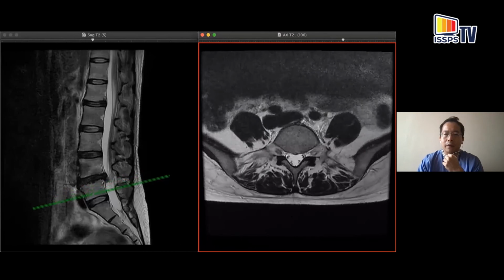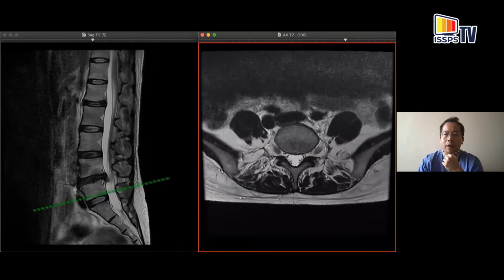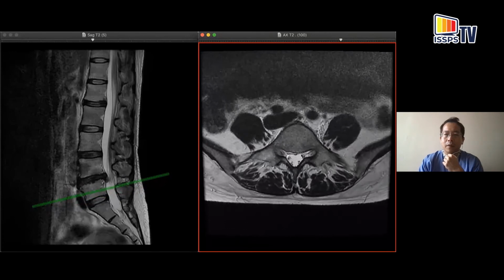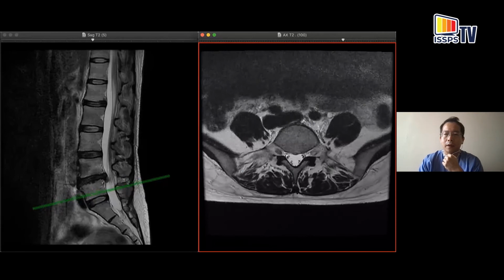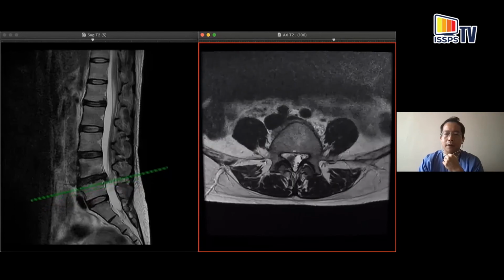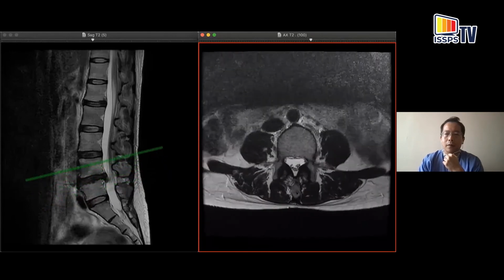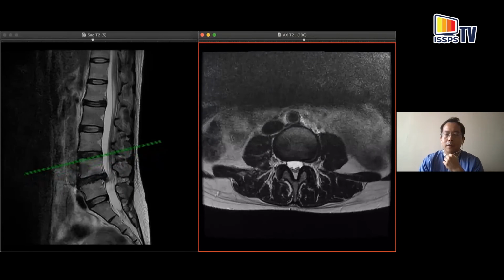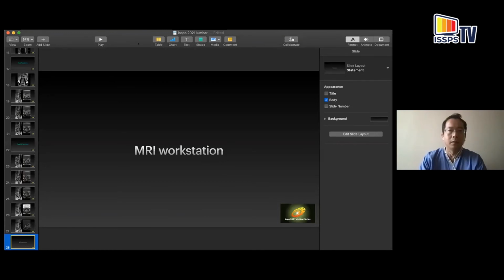And then now go back to L5, and you can see everything sort of restoring its natural order around the central canal over here. But at L5, the bony margins of the central canal are triangular, as Dr. Bernard showed us. So once again, running upwards just very quickly to show you guys this. Once you're at the level of the transverse processes, you are usually at the level of the lamina. But once you go upwards and you start to see facet joints, you're usually at the level of the exit foramen. Okay, we return to the lecture now.